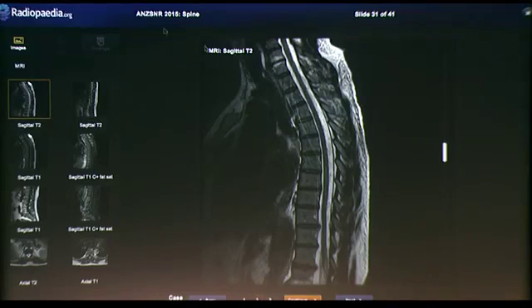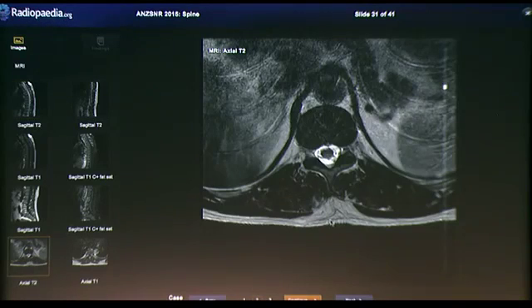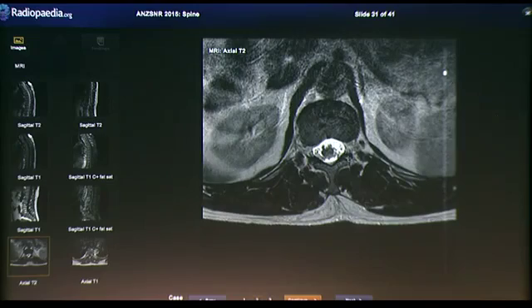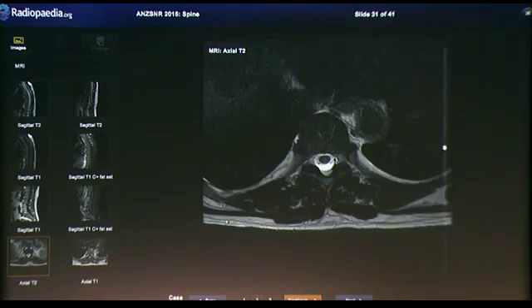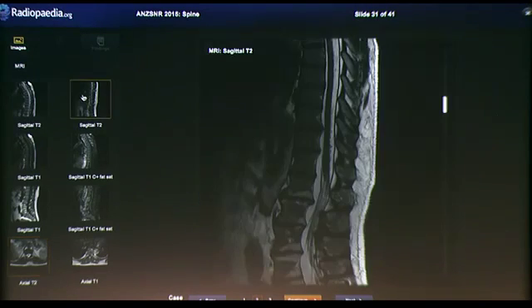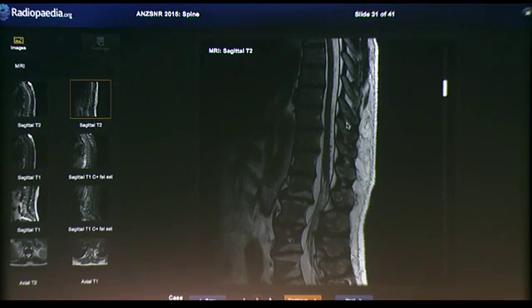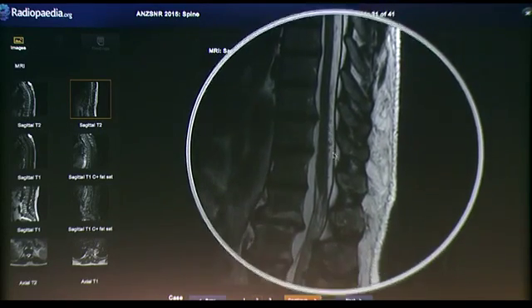Our next case is a 64-year-old male with 8 weeks of lower limb numbness. So the T2 hyperintensity is less extensive in this case. It involves much of the cross-sectional area of the cord, from the conus up about 4 or 5 segments, maybe a little bit expanded, but the cause of this, there's a clue on this image, which is these prominent flow voids.